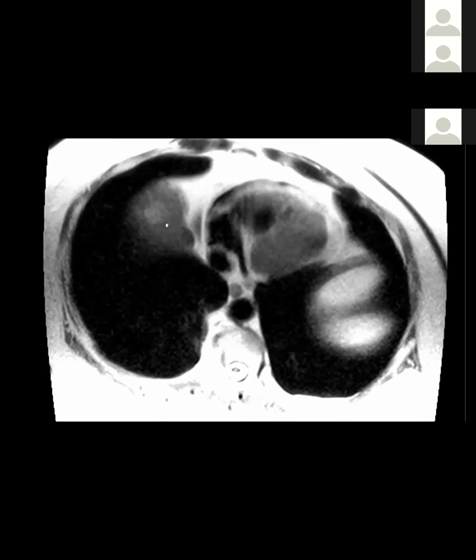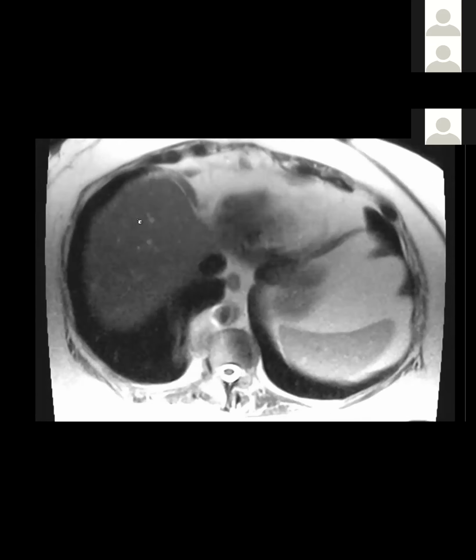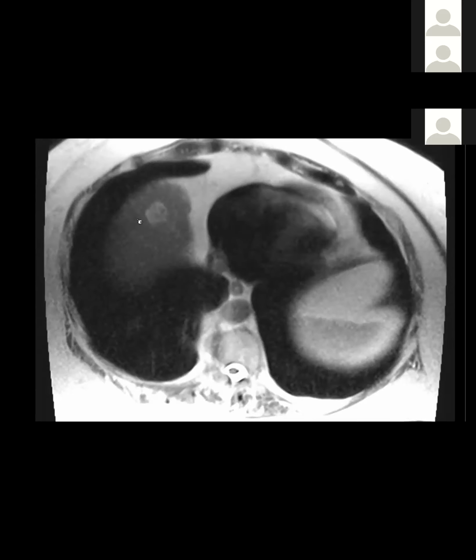To me, that looks a little concerning, but if I'm proposing atypical hemangioma, I usually recommend a follow-up. This is not our case, so I don't know if they qualified it as atypical or just said hemangioma. To be honest, I have seen hemangiomas where everything else is typical and the T2 signal is just not perfect. There are sometimes sclerosing components.